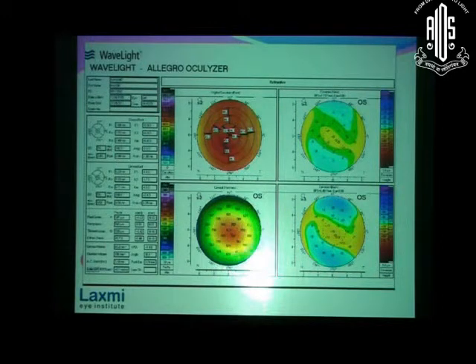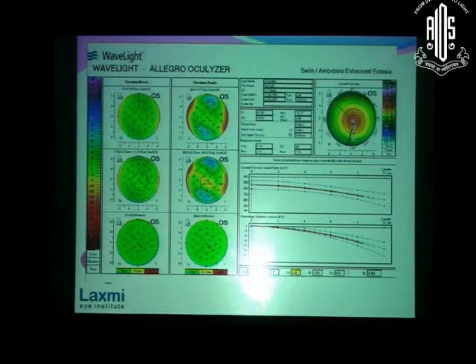Now the other eye of this patient has fairly normal keratometric values, nothing exceeding 47. The anterior float values are definitely less than 10 at all points. However, the posterior float values are borderline, about plus 18 on this system, and posterior float values of more than 20 are taken to be significant. He maintains a good pachy; the thinnest pachy is just 539, which is very good. So this particular eye has to be under observation. As far as now is concerned, this particular patient does not have keratoconus.